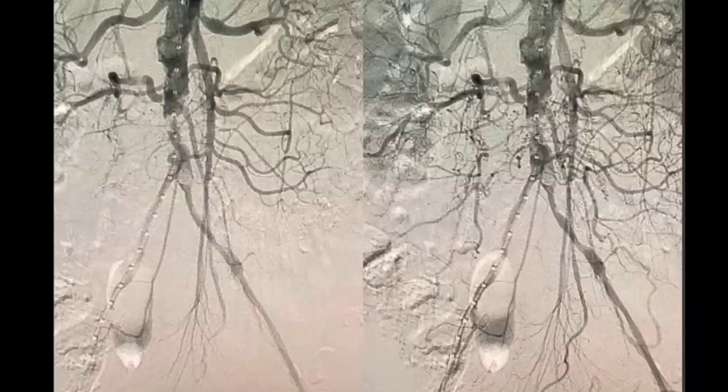But the problem is that the distal aorta before bifurcation is showing some narrowing of the lumen, and even the common iliacs are also showing narrowing of the lumen as compared to the normal I have just seen. Secondly, I can see the common iliac continuing to the external iliacs bilaterally, but I can't appreciate the internal iliac vessels here.